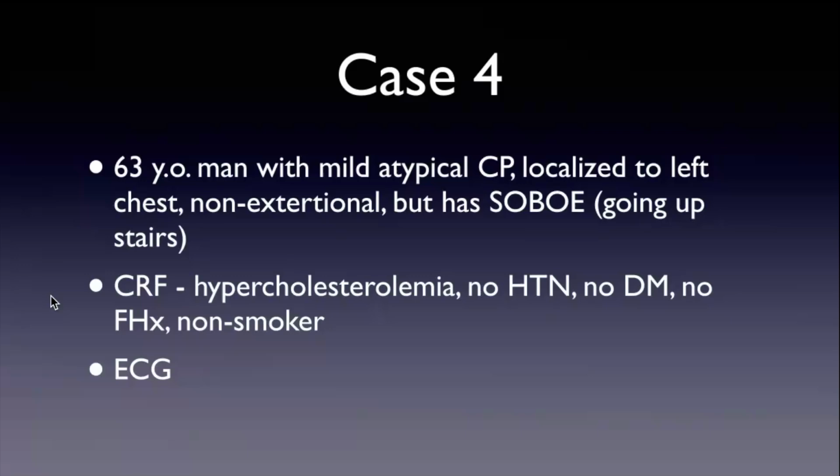Diverticula are more likely to extend outside of the myocardium. They bulge out, and you can tell from the LV angiogram it really does look like it's extending well beyond, because the walls are not that thick. So I think that's really the differentiator. Thank you. It's the setting and the depth of the thickness. Yeah.